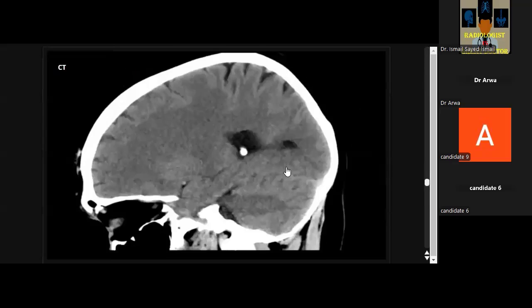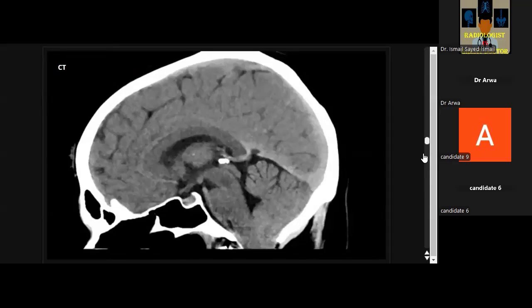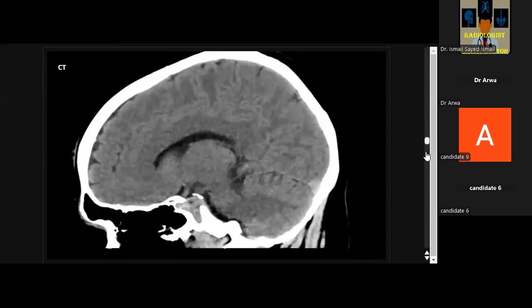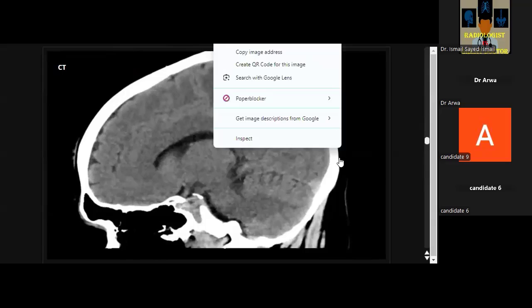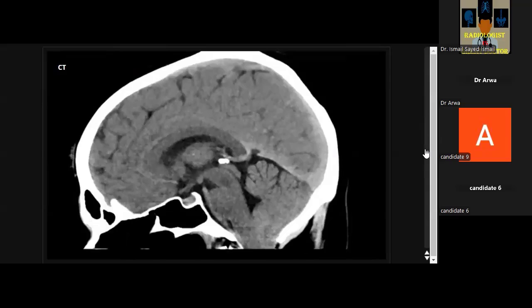Okay. So I'm provided with sagittal images of the same patient. I'm trying to scroll, and I can appreciate that it's quite zoomed out. Just leave it. Yes. I can appreciate that there is significant herniation of the cerebellar tonsil into the foramen magnum, which is causing compression upon the cervicomedullary junction.